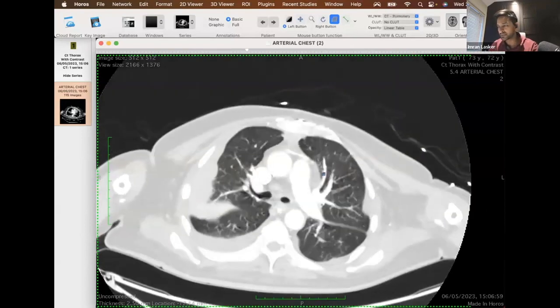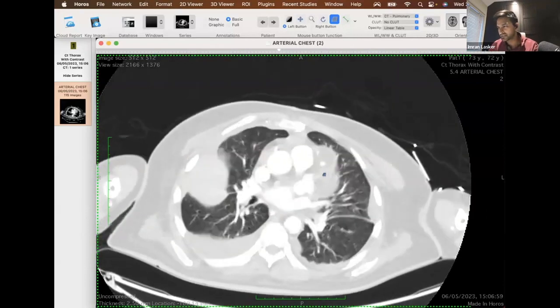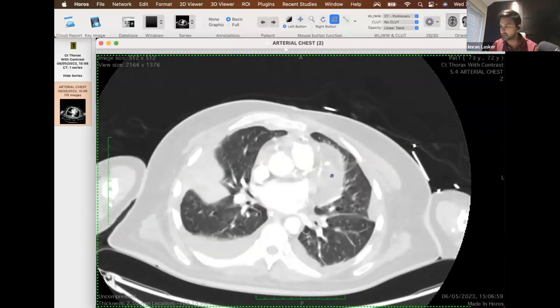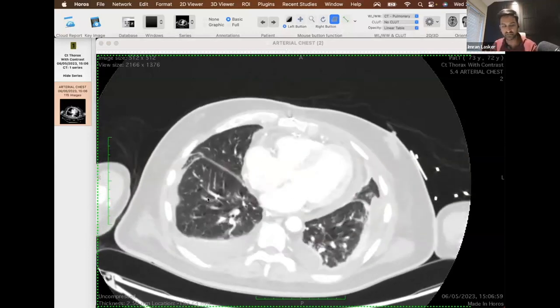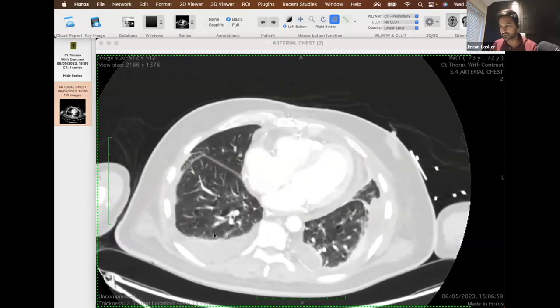Now let's go to the lung windows, and we can see what looks like a lot of breathing artifact. For those that don't know what breathing artifact looks like, it's where you can't see the entire continuation of the vessels all the way through. They look like little swans rather than straight vessels. That usually happens because the patient's very breathless, and they haven't been able to hold their breath, so the lung hasn't stayed still. You get this fluttering appearance to the lungs. You can see in these regions over here, they all look like seagulls, not the linear straight appearance that you'd otherwise get.